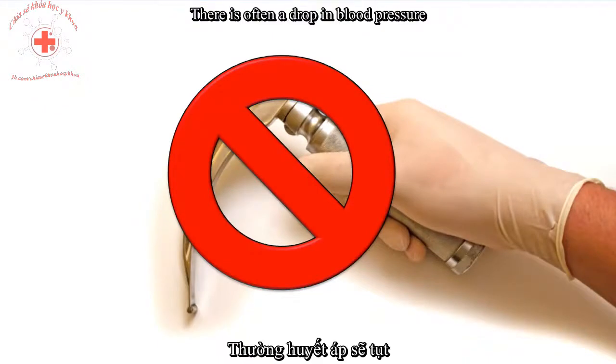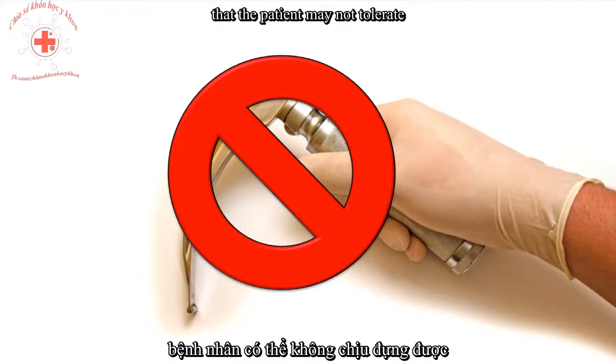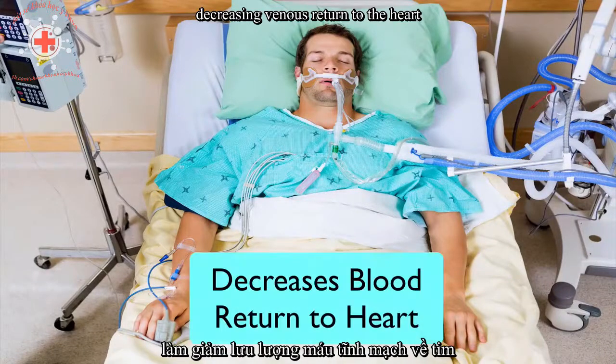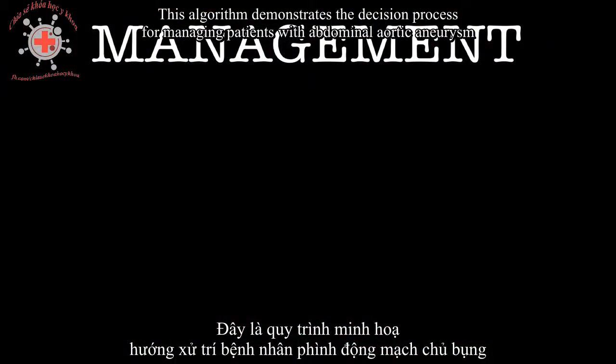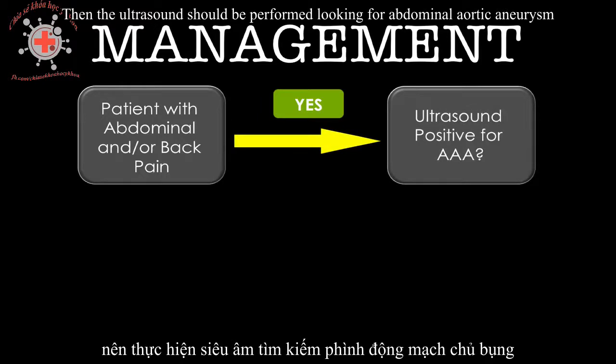There is often a drop in blood pressure after performing rapid sequence induction and intubation that the patient may not tolerate. This is thought to be caused by the effect of positive pressure ventilation decreasing venous return to the heart. This algorithm demonstrates the decision process for managing patients with abdominal aortic aneurysm. If an at-risk patient has abdominal and/or back pain, then the ultrasound should be performed looking for abdominal aortic aneurysm.